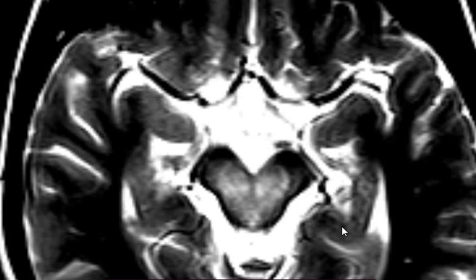First, second, what would you do? Abdomen ultrasound, looking for the liver. Looking for what in the liver? Tumor. Copper deposition. How do we see copper deposition on ultrasound? Echogenicity. Echogenicity, you look for what?